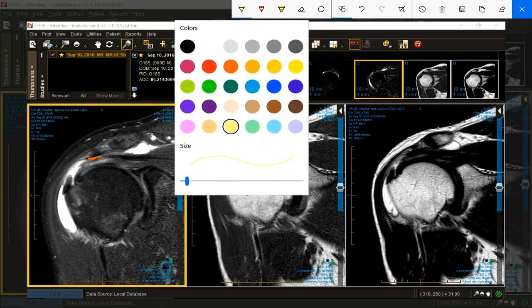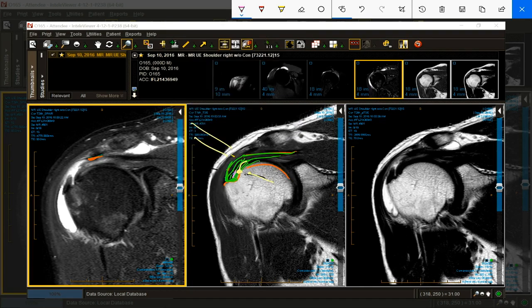What would happen if we sheared off the deep fibers of the rotator cuff? These fibers. If all these fibers were torn and they retracted back to here, but the outer shell was left intact, can that happen? In other words, can the rotator cuff do this? Slide out the deep fibers? You bet it can. That is called a pasta lesion, a partial articular sided supraspinatus tendon avulsion, usually without bone.